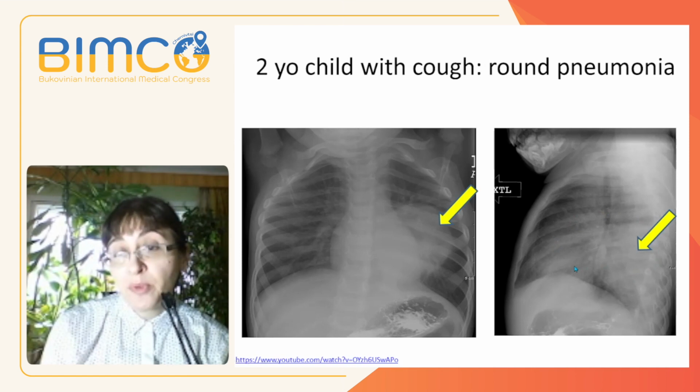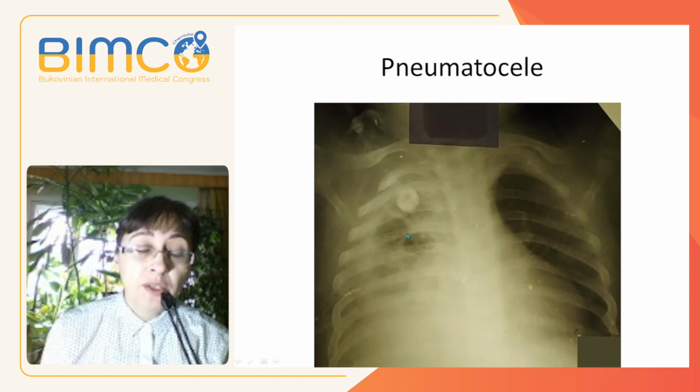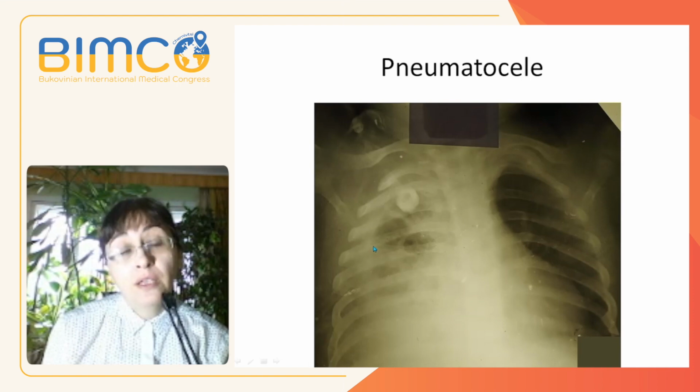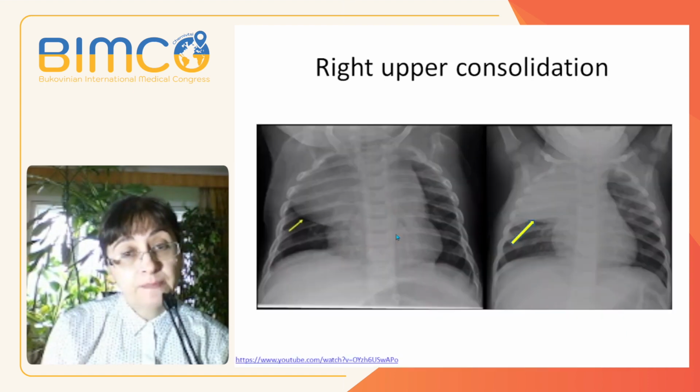So it is typical for childhood, and never observed in adulthood. This child manifests with right-sided total pneumonia, but you may also see a complication associated with typical staphylococcal etiology of pneumonia, like pneumatoceles or parenchymal destruction with air-filled opacities.